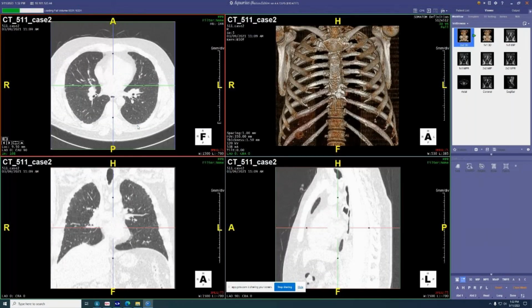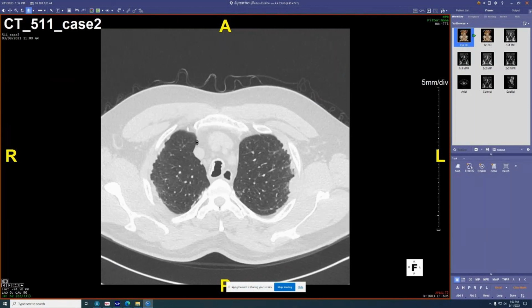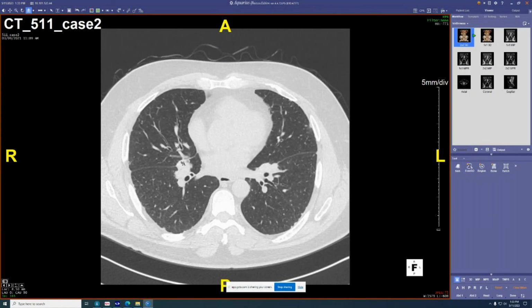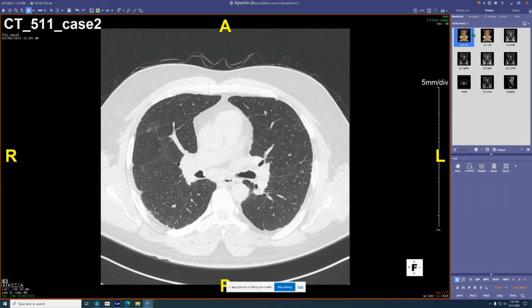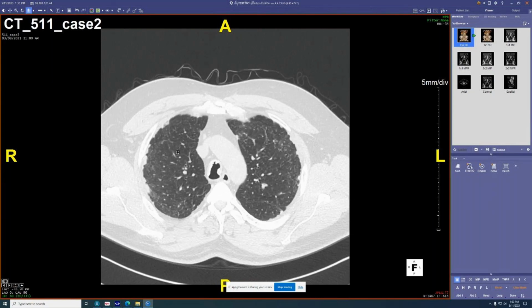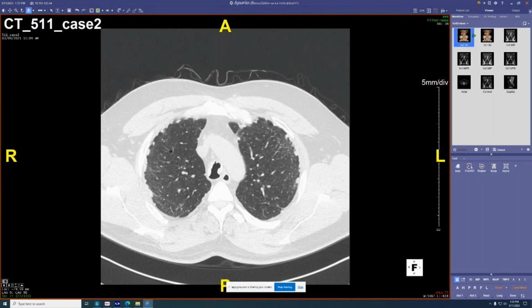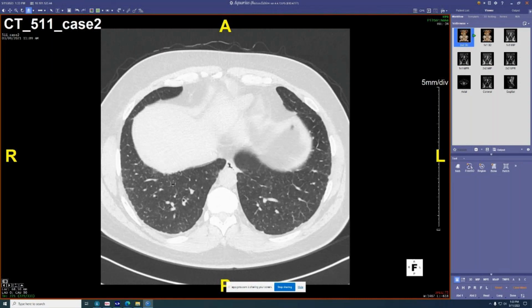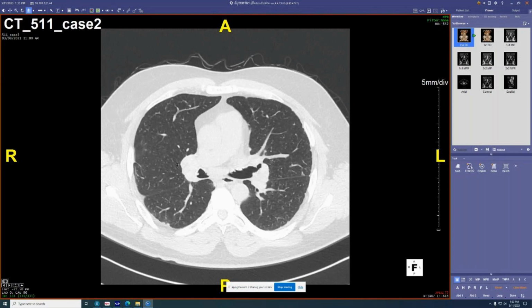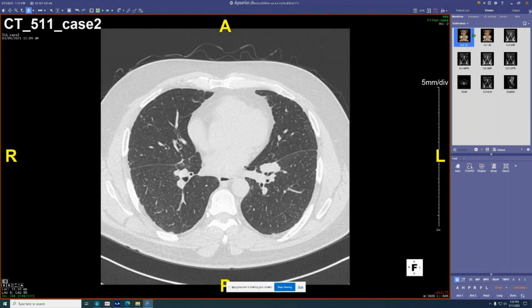So here's a guy with big lymph nodes and pseudoplaques and a bunch of nodules that are hard to put in a specific distribution, really kind of randomish. I really couldn't say they're all perilymphatic. I would personally call these random. And these, again, symmetric mediastinal hilar lymphadenopathy and these pseudoplaques, I would have thought sarcoid, but this actually turned out to be silica.